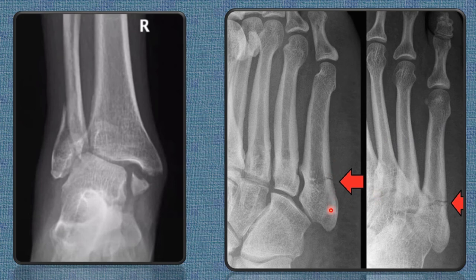Now you can see this is an incomplete fracture, this is an incomplete fracture, right? This looks like a transverse, but we cannot say transverse, it is an incomplete fracture, right? And here you can say fragmented. So this medial malleolus is pulled down. Maybe there is a ligament attached. So this is the eversion injury, in which you can see there is also a breach within the lateral malleolus, this one. Can you see this? There is a break in continuation, and you can see this coming obliquely.